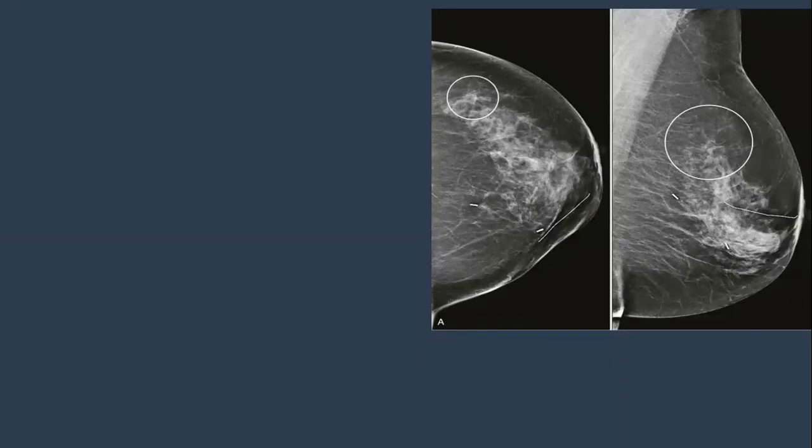If the patient had this long ago, many years before, no biopsy, and this is normal after many years. After many years, you see this picture. Okay, any other suggestion? Do you always agree with her? Are you going to ignore this patient and say this is normal because she has had a previous intervention? I'm going to do a biopsy for her.